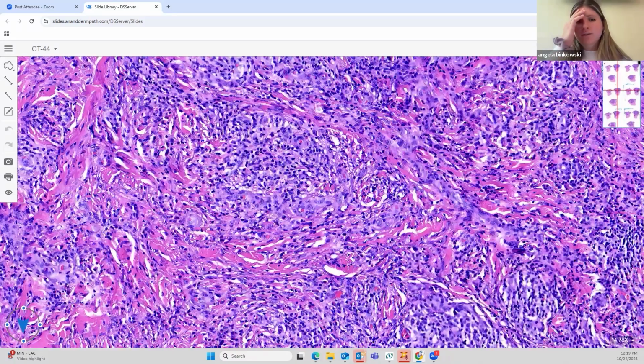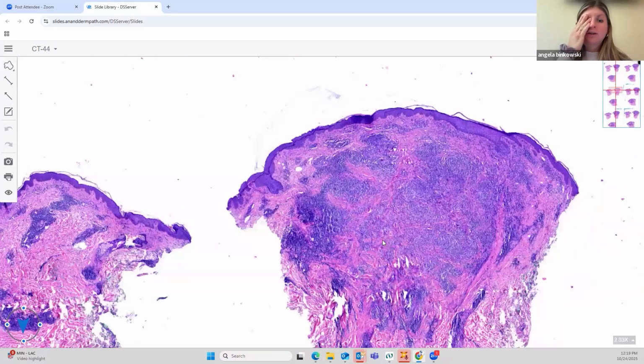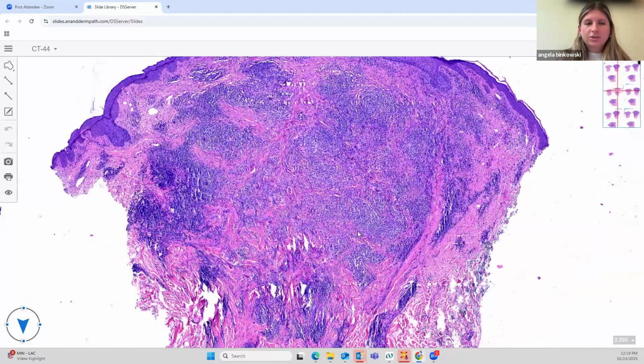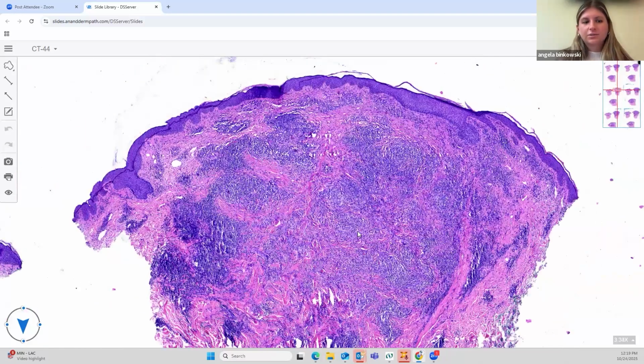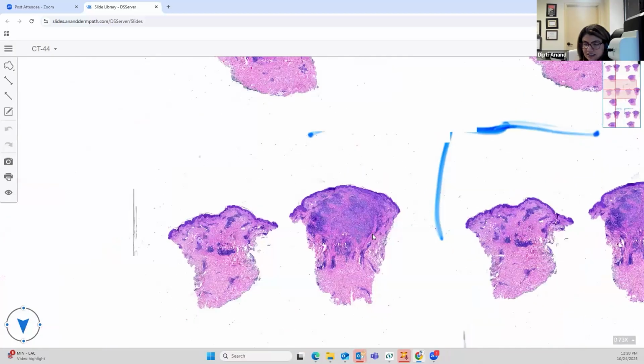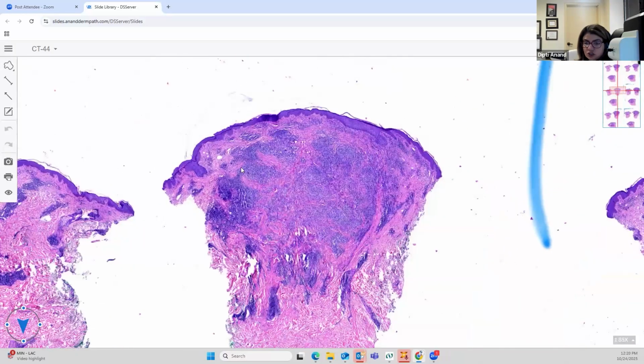In the dermis, I think we have a lot of palisaded granulomas, and then in the middle, there's some necrobiotic collagen. So I was going with GA. Okay, so this is probably a common mistake. When you see a nodular lymphoid infiltrate with a little paleness in the center, which is wedge-shaped, you see the wedge-shaped architecture again, right?